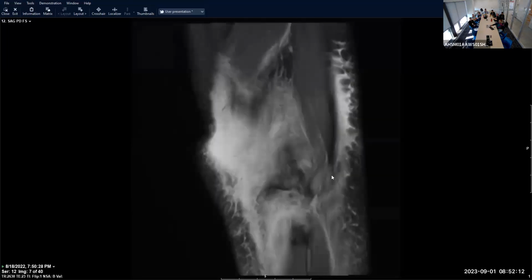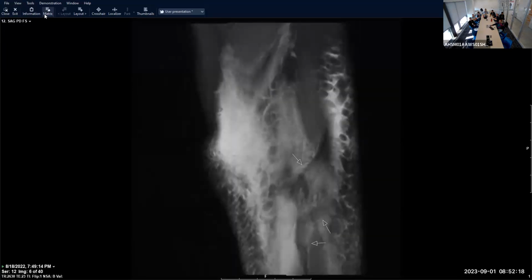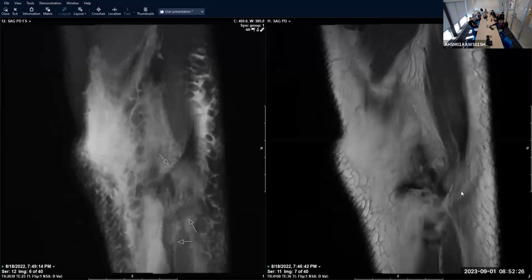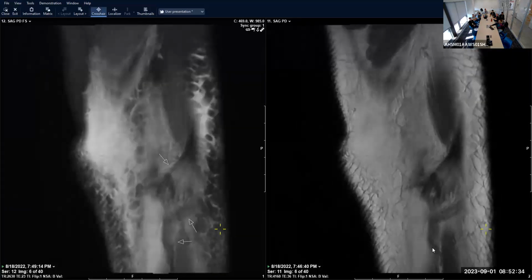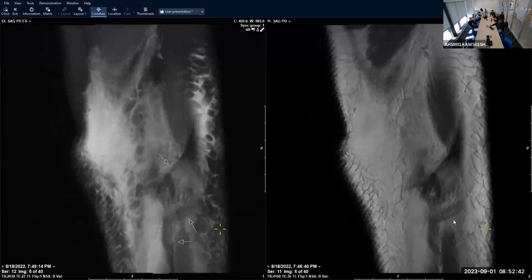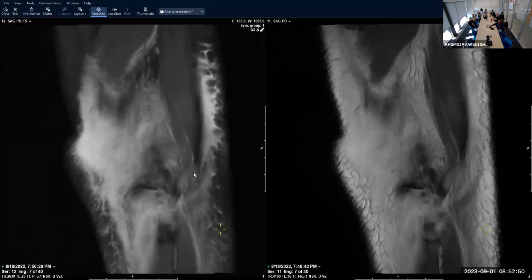All right, so peroneal nerve, right? We saw it on the normal cases a few different times. Let's do this. Okay, put our crosshair up. Okay, so here it is. It's not supposed to make 90-degree turns, I'm pretty sure. So that's not good. It's got some sort of injury here, and we're going to further evaluate that on the axials. Here's our biceps femoris, which is also not supposed to be turning in its morphology. It's supposed to be relatively taut, so I'm a little bit concerned that that's torn.